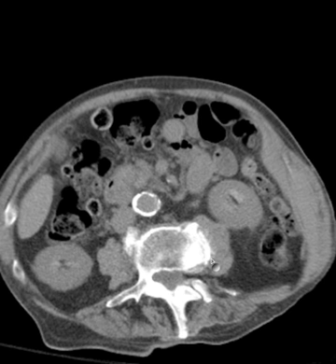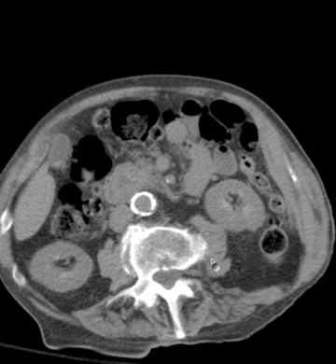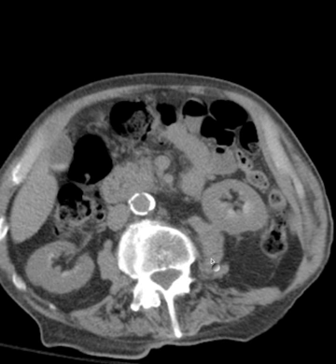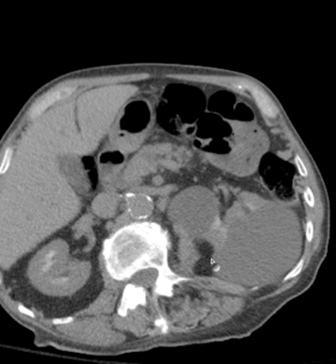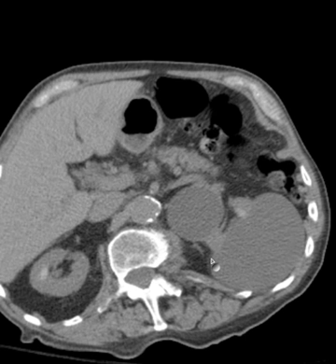Not much going on the right side. But look at the renal medulla, the renal pyramids on both sides. Look how they're high attenuation. Now this is one of the more high attenuation findings of that sort that I have seen, and you can get renal calcinosis that involves the medulla and that occurs actually more often than the cortex.